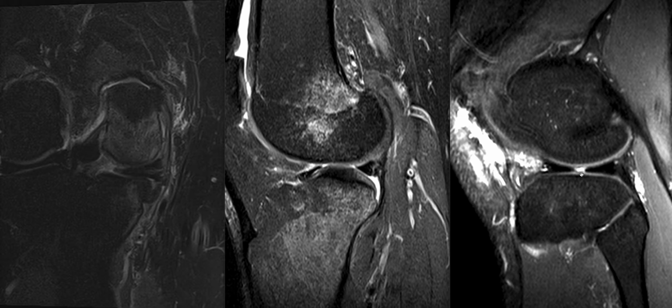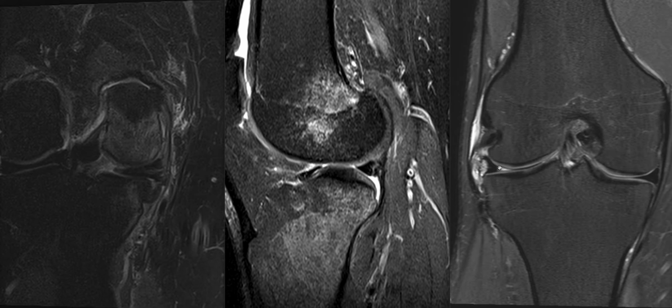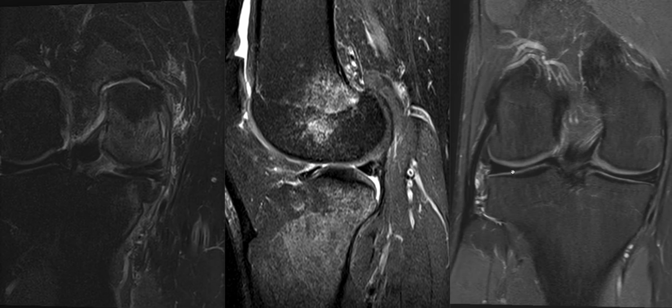With this location, if we go to the coronal image, we see that rather than a cleft, we see an area of the meniscus where the normal black signal has been replaced by fluid. And this is sometimes referred to as a ghost sign. So a radial tear is associated with a cleft in one plane and a ghost in the other plane. The other location for this type of tear is near the posterior root of the meniscus.